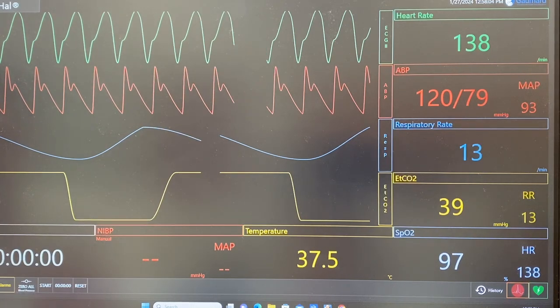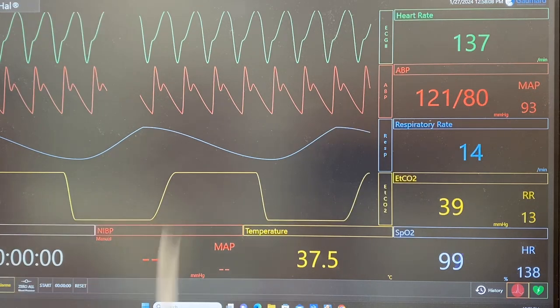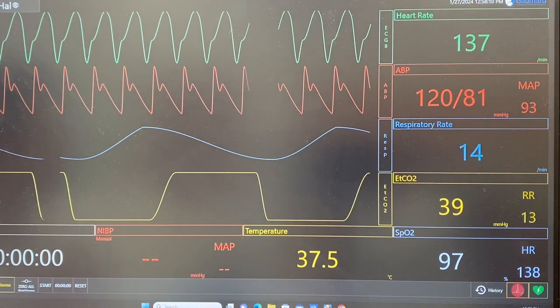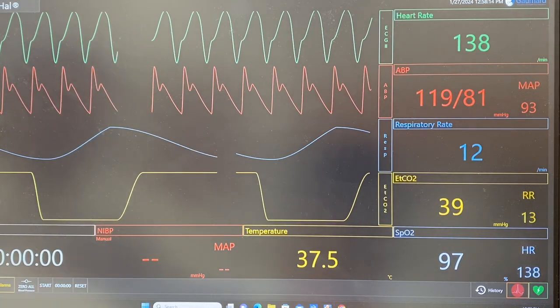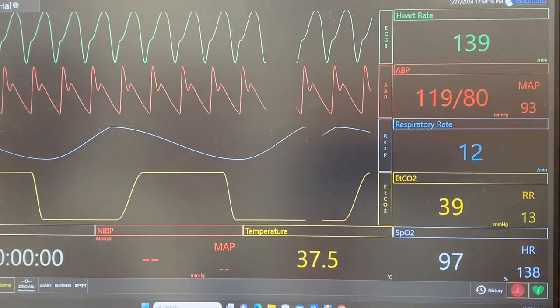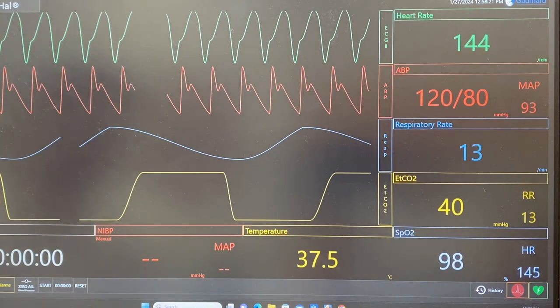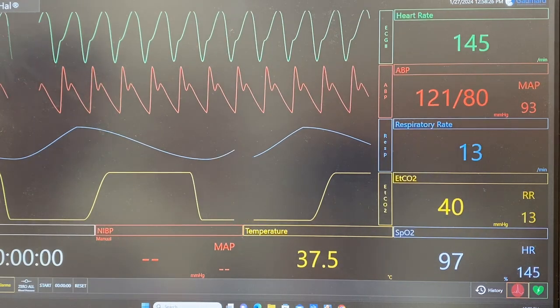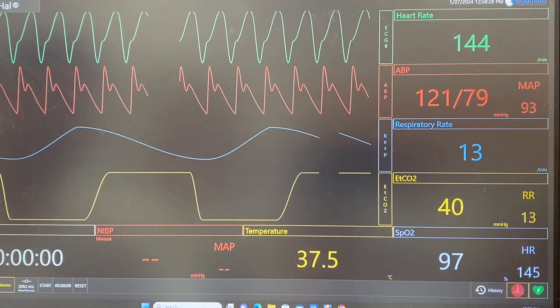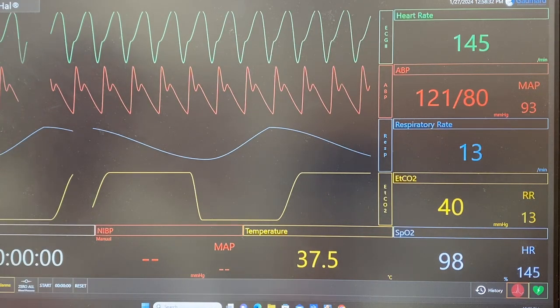Now on the Joshua, that's the one you say you don't really like. Oh, you count the R's? No, don't do that. That's so basic. You're more intelligent than me. Well, this one is very accurate. Your method is very accurate. Don't, it's not my method. It's the standards of medicine. Okay. All right.